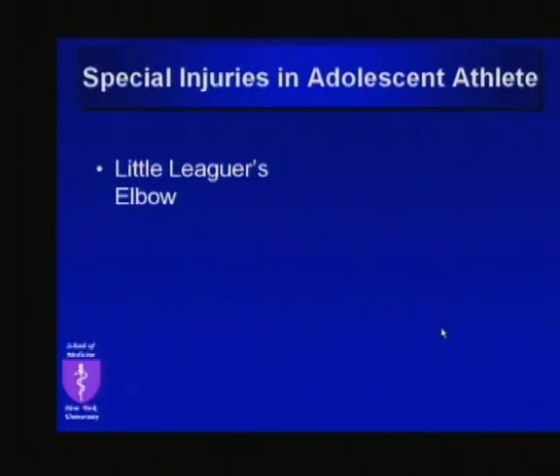In the last few minutes here, I'm going to touch very quickly on some special injuries in the adolescent athlete. We'll start with little leaguer's elbow. This is kind of a wastebasket term. Incorporated under this umbrella of little leaguer's elbow is injury to the medial epicondyle. First of all, the common injury here, or the mechanism, is much as what you would have with MCL injury in a more mature pitcher. In a young throwing athlete, before you fuse your apophysis, the valgus stress can result in little leaguer's elbow.